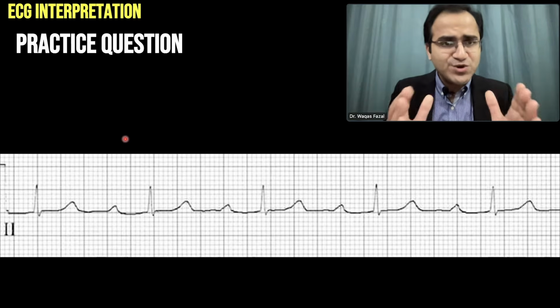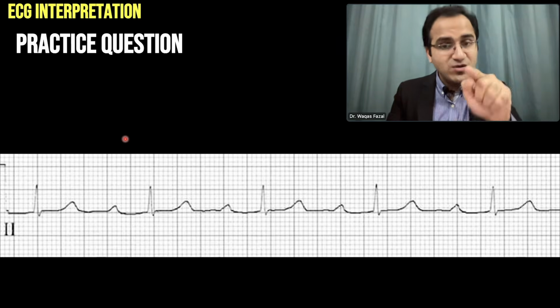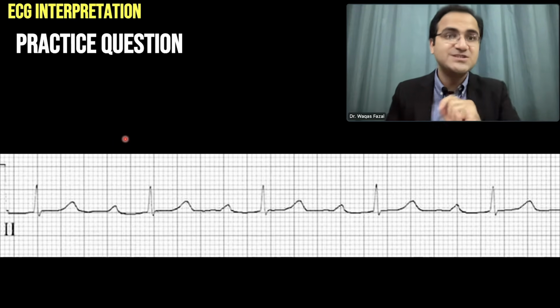Now, what you should do is you should pause this video right now and solve this ECG. Solve it yourself so that you learn and always remember this point.